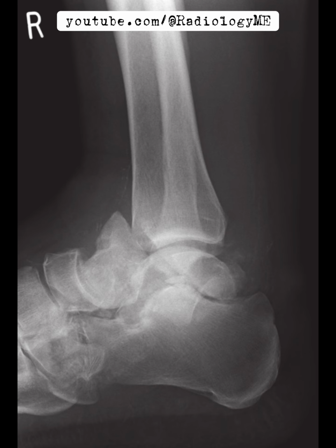However, if the patient has a history of severe trauma, we'd also have to consider whether this represents an acute injury, potentially in a patient with vascular disease. The vascular calcifications add weight to this possibility, so we'll need to keep that in mind too. What would I do next? I'd definitely ask for another orthogonal view to get more detail. I'd also discuss the case with the referring clinician. Given the possibility of an infection complicating things, maybe there's an infected collection, we might need to assess this further with MRI. Especially in cases like this, you want to be sure you're ruling out osteomyelitis.